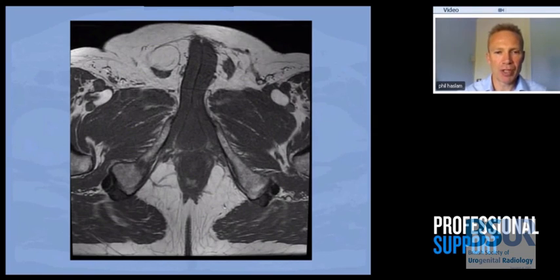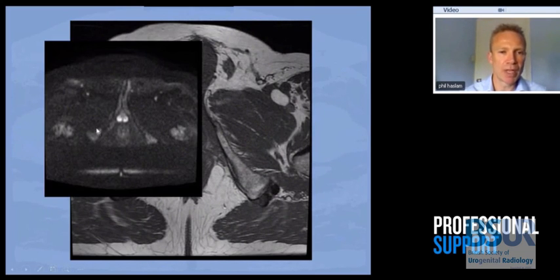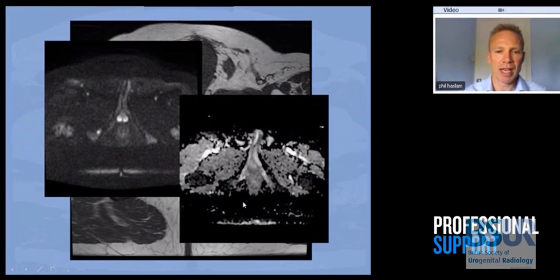This patient here on the T1 weighted scan, you can see there's low signal, early bone metastasis in the right inferior pubic bone, so more into the ischial bone. There it is, high signal on the B1400, and it's low on the ADC map. This turned out to be a bone metastasis, and sometimes you can see these high signal on the B1400 well before you'll see changes on the T1 weighted scan. So the diffusion weighted imaging is actually very sensitive.